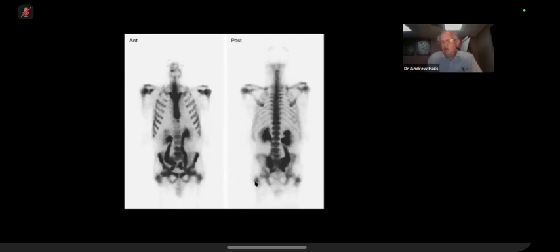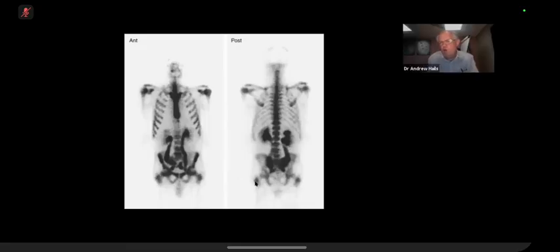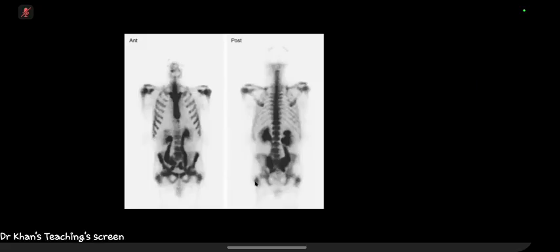Does this image really suggest hyperparathyroidism? Sorry? You mentioned hyperparathyroidism. Well, why do you think this might signify hyperparathyroidism? I was just trying to see how the bony involvement and the kidney involvement can come together, and that's the only logic behind it. I can't be completely wrong though.